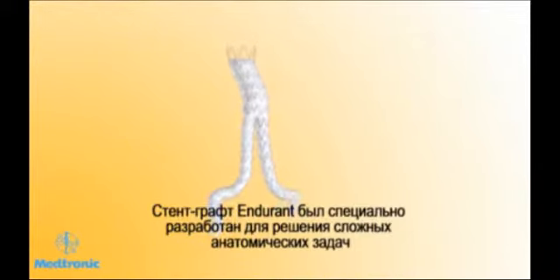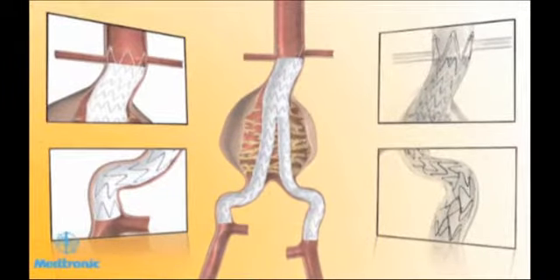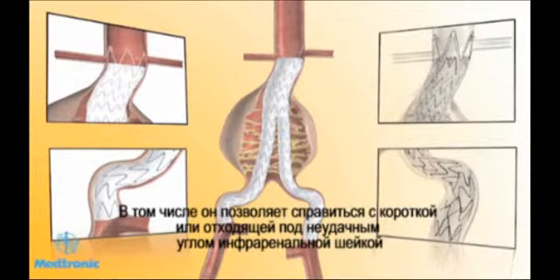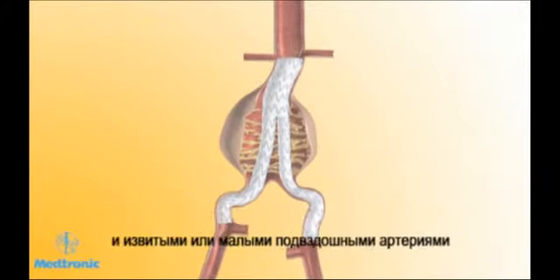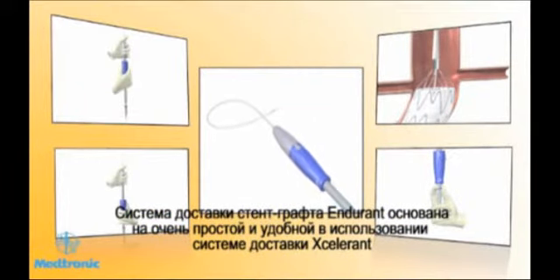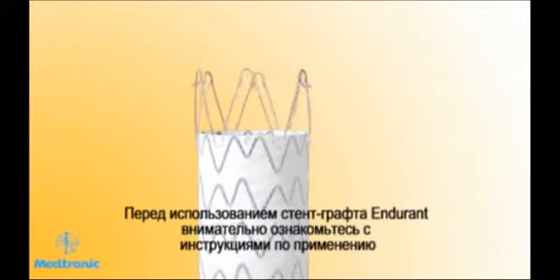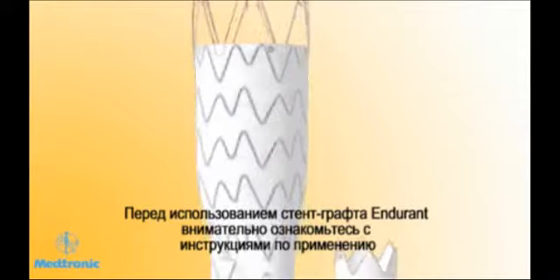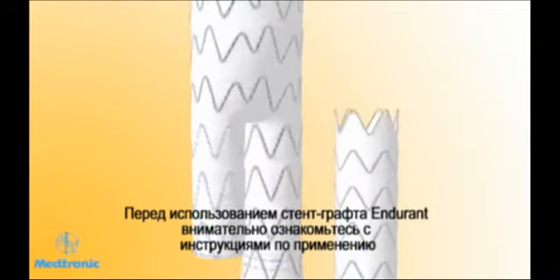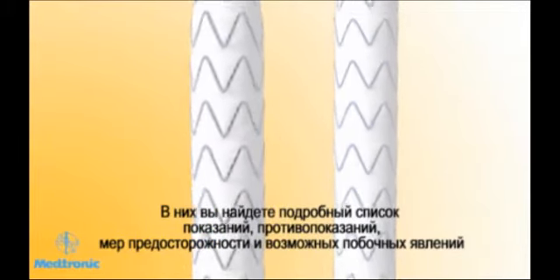The Endurant stent graft system has been specifically designed to perform in patients with challenging anatomies, such as those with short or angulated infrarenal aortic necks and tortuous or small iliac arteries. The Endurant delivery system is based on the easy-to-use Accelerant delivery system with an added tip release mechanism. Prior to using the Endurant stent graft system, please review the instructions for use to obtain a detailed list of indications, warnings, precautions, and potential adverse events.